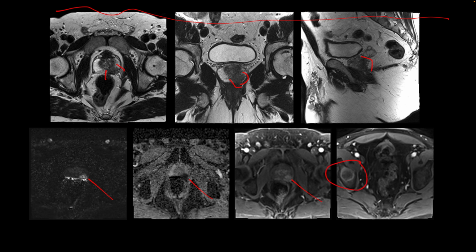In the right ilium, there is a focus of enhancement, peripheral enhancement seen in the bones, and this is a bone metastasis. So remember to look at the bones when you're reading the MRI of the pelvis to evaluate a patient with prostate cancer. You may be able to pick up some bone mets that can show enhancement, as well as other things like restricted diffusion.